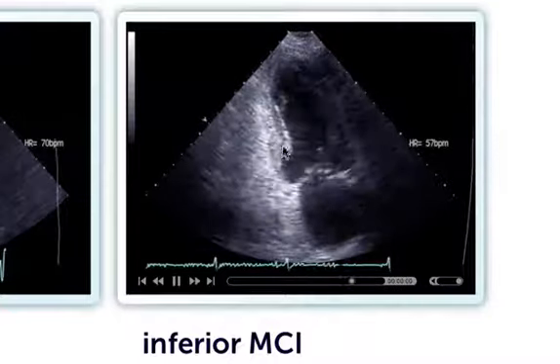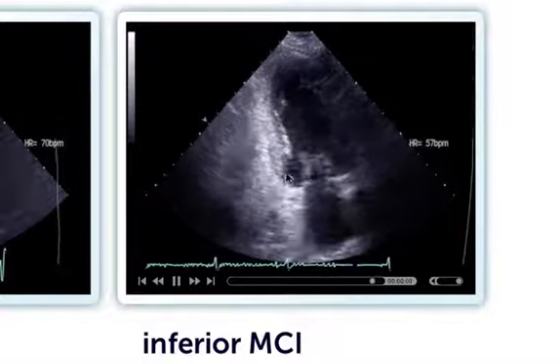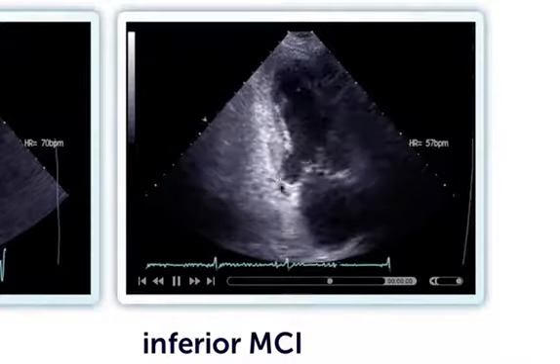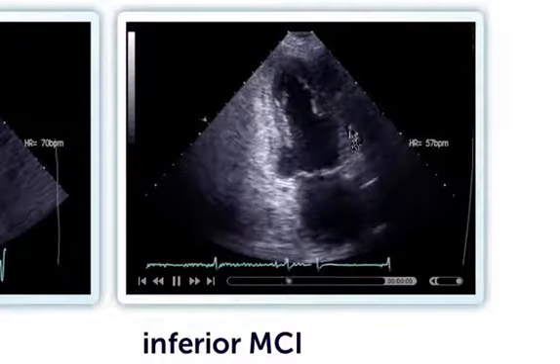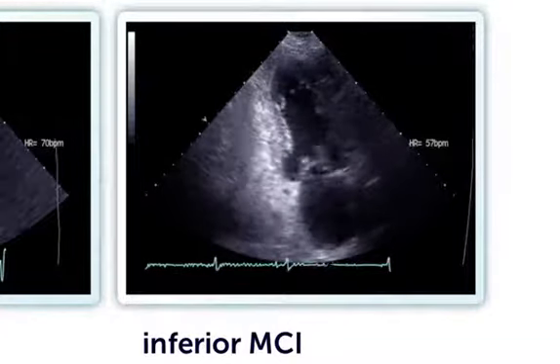We see an abrupt change in the thickness of the myocardium. So this seems to be scar. We'll talk about the importance of scar later. And we see that there is no motion at all here, only passive motion caused by the motion of the mitral annulus, and the remaining part of the myocardium seems to contract normally.